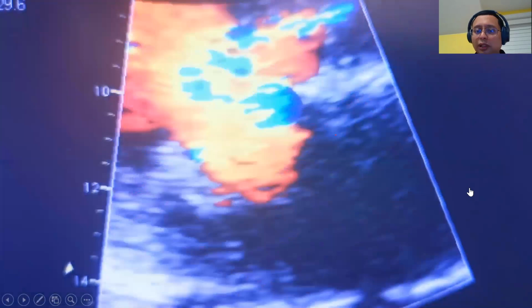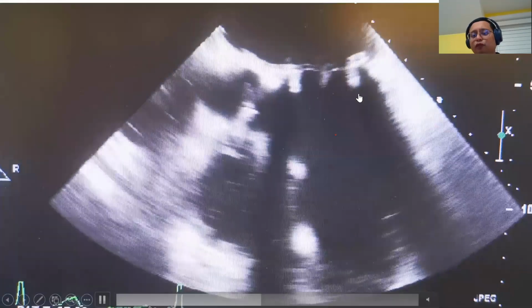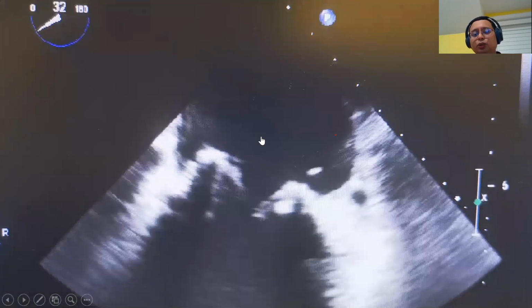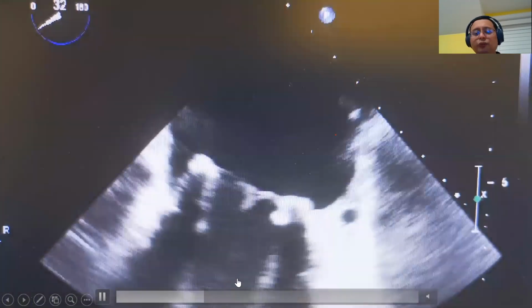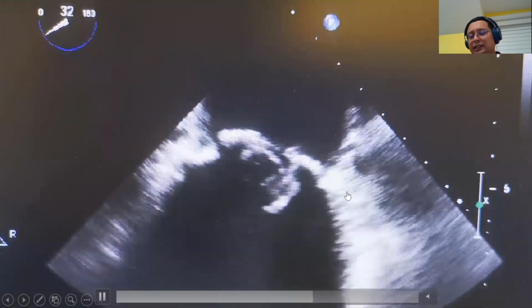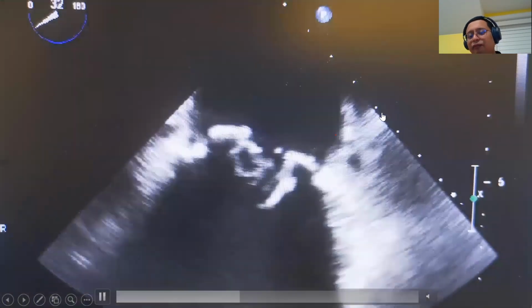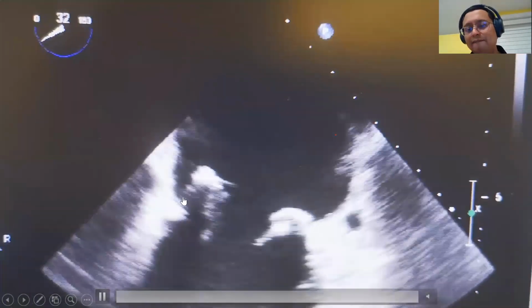So we go to transesophageal echocardiogram and lo and behold, this is the TE four-chamber view: LV, RV, LA, and RA. You cannot see anything, right? This is the two-chamber view. Can you see any problem, for those of you with sharp eyes? Remember, when you do the two-chamber view, that is the left circumflex, that is the coronary sinus. Whenever you see the left atrial appendage in TE, that is your lateral marker. So that is lateral, that is medial.